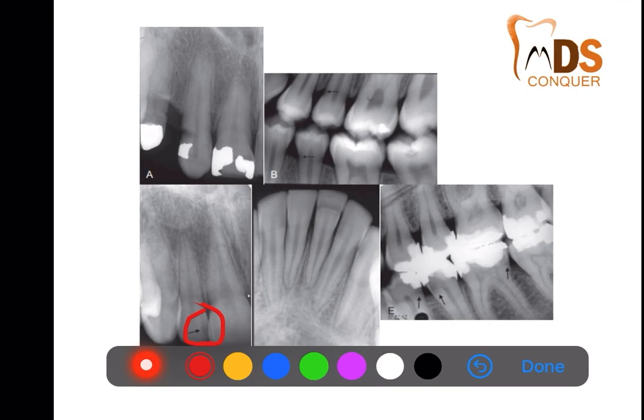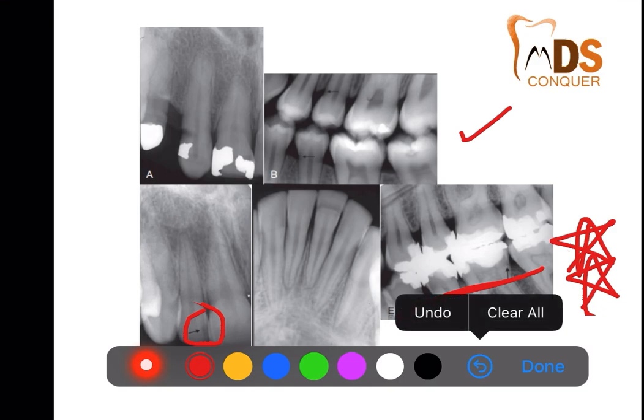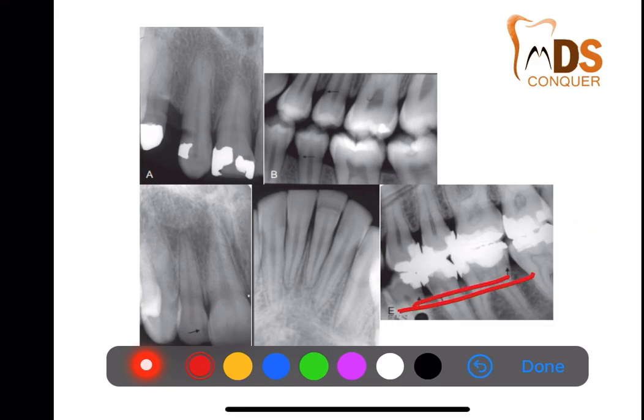Okay, this particular radiograph is very, very important to underline. Why? Because here the shadow of the alveolar bone has fallen over the roots of the molars, showing a radiolucency over the roots, which is nothing but the Mach band effect. Very important, Mach band effect.